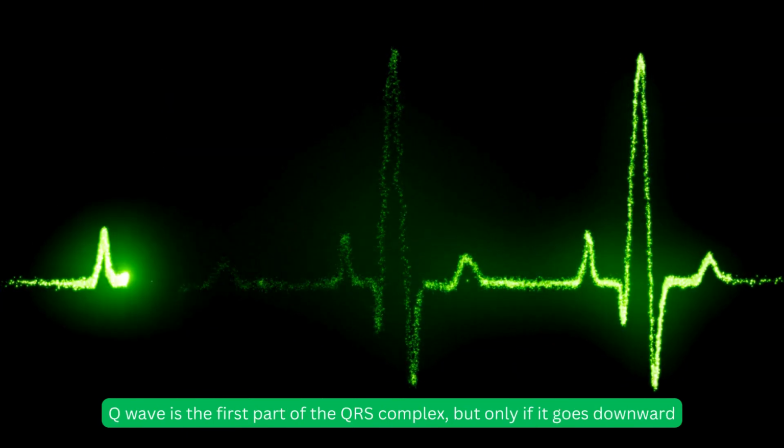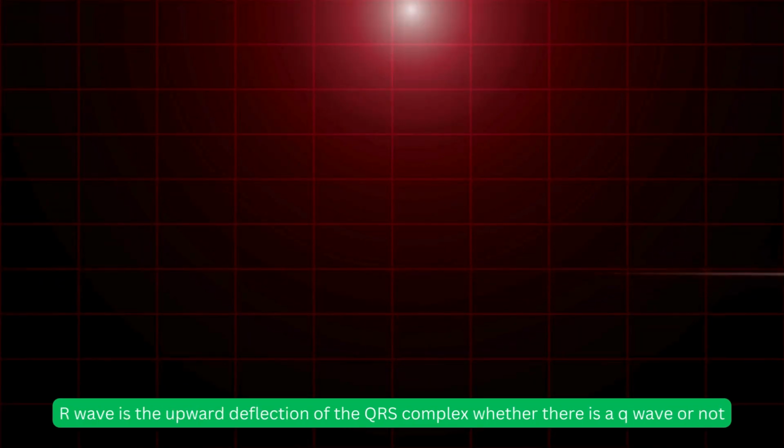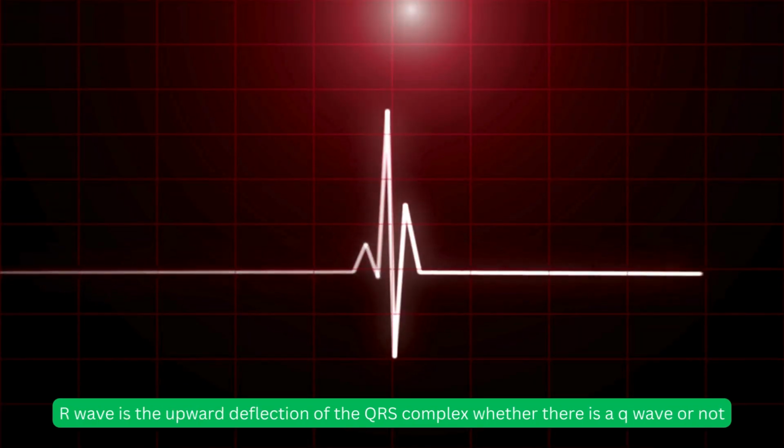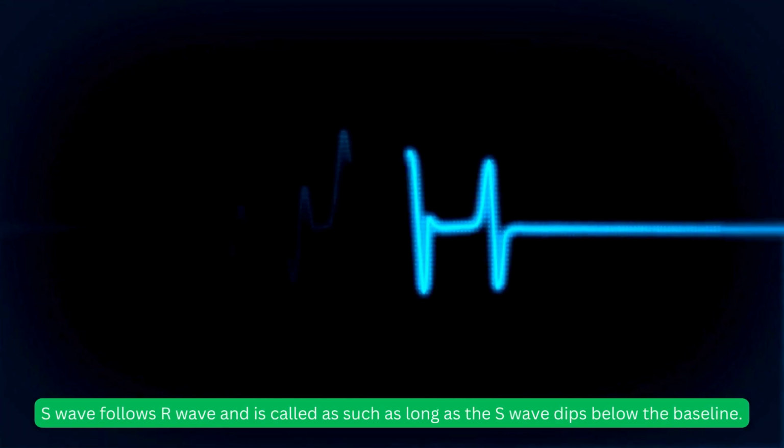The Q-wave is the first part of the QRS complex, but only if it goes downward. The R-wave is the upward deflection of the QRS complex, whether there is a Q-wave or not. The S-wave follows the R-wave and is called as such as long as the S-wave dips below the baseline.